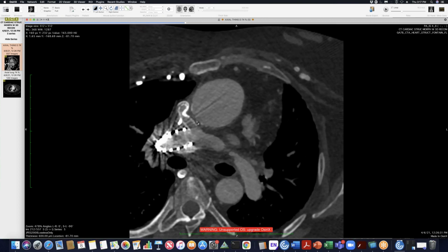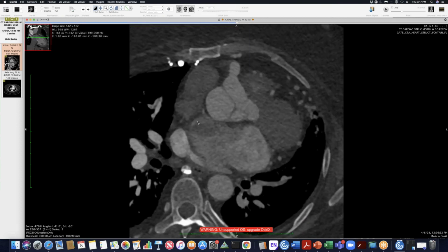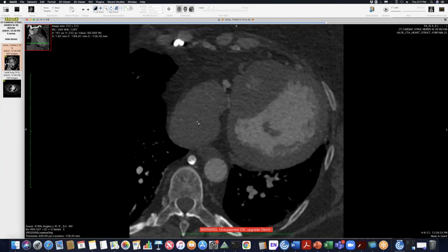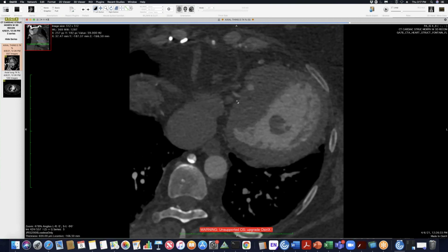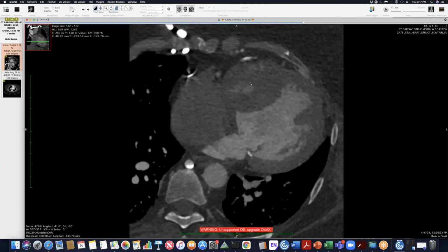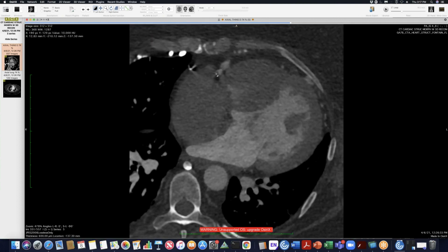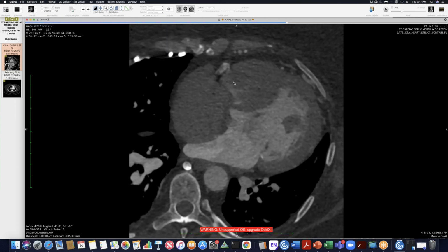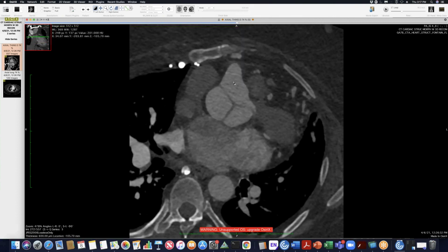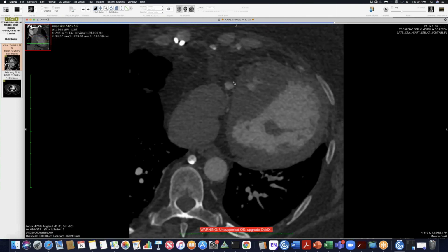Peter, I had a question about that coronary fistula. It's now retrograde flow. So what's the long-term outcome for that coronary, since that RV is so small? The RV actually gets really high pressures. So there is good pressure supplying this coronary from the RV, so that's not a problem. But the problem is if you decompress, which they are doing with this POTS shunt, they're decompressing the right circulation, you can get steal from the RV.